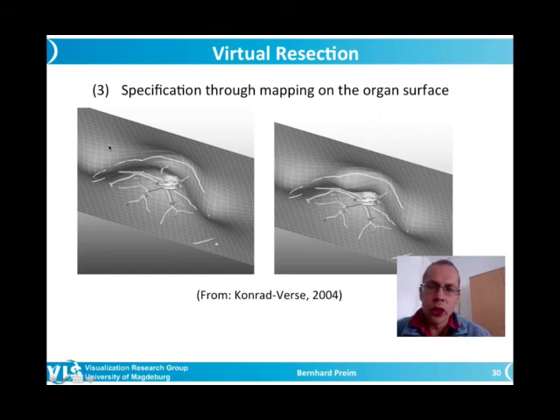That was an initial cutting plane defined with the technique, with the principal component analysis. Here you still see what the user has specified. You see a tumor and some vascular structures in the surrounding. And here you see that the user adapted this deformable cutting plane. Here you see it. Yeah, that was flat here, and here the user has adapted it in order to translate parts of the resection plane.